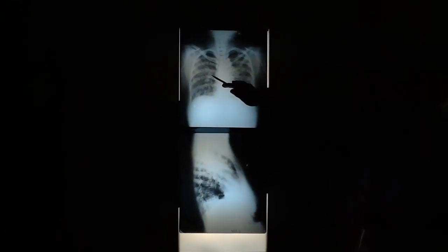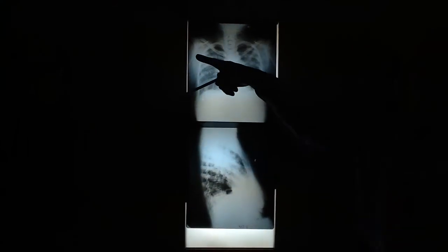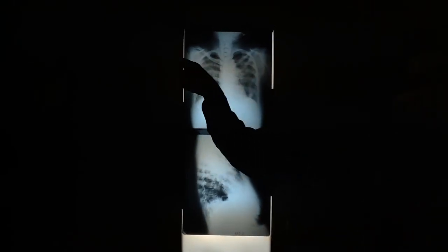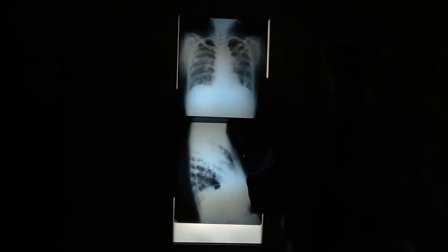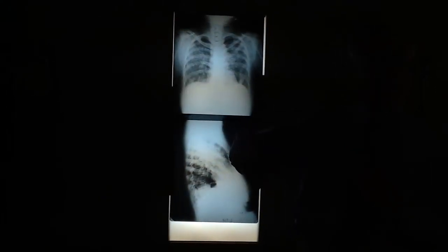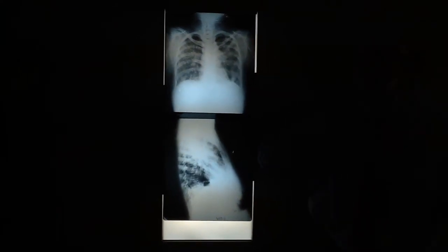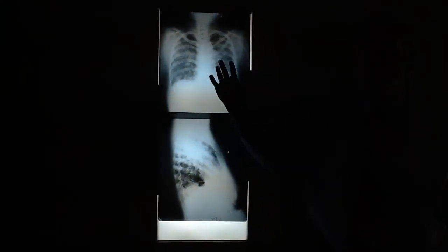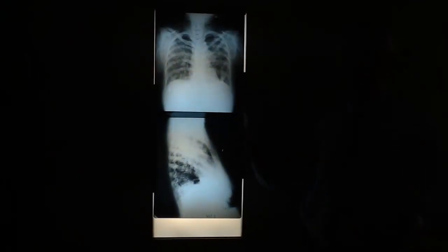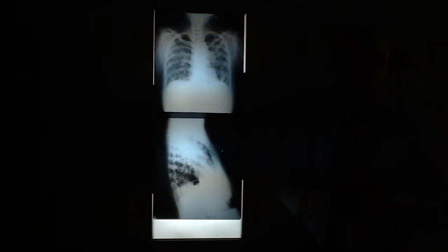But what do you think about the hilar areas that we can see in the right paratracheal? Do you see any lymphadenopathy here like over there? No. In most patients, they go from that to combining lung disease with it, and then the lymphadenopathy goes away. So this patient probably has already gone through the lymphadenopathy, and they're in the lung disease stage without the lymphadenopathy. Lymphadenopathy's gone, which is generally about the third stage.